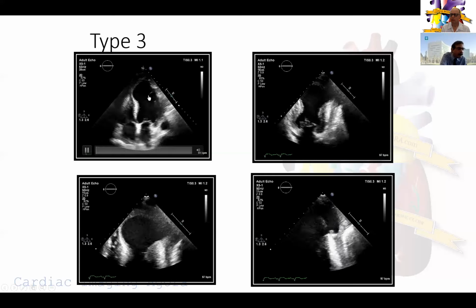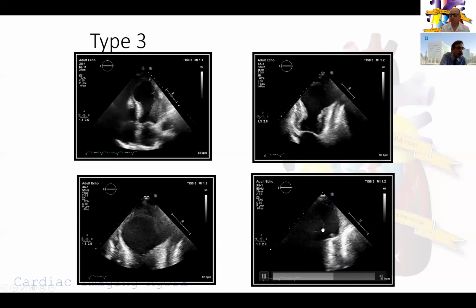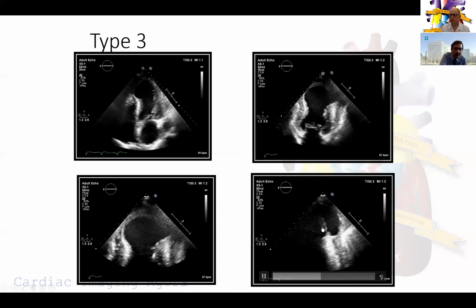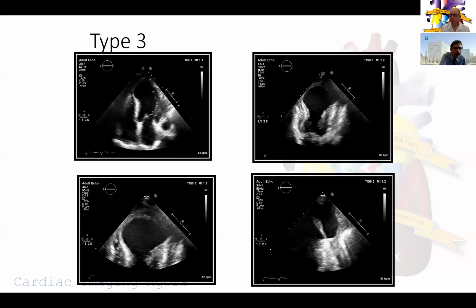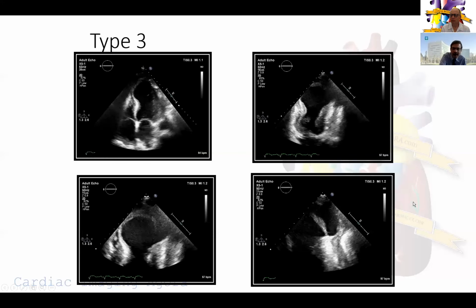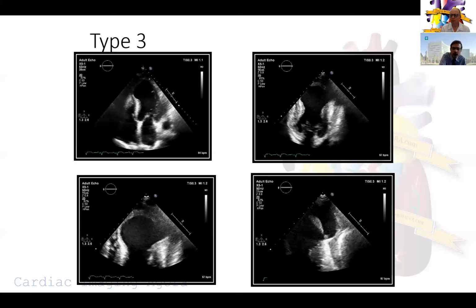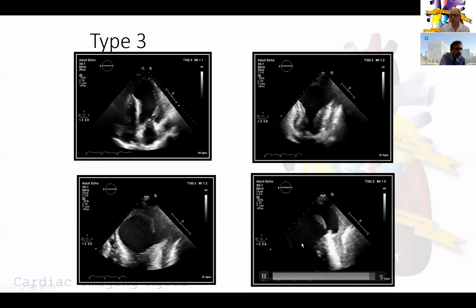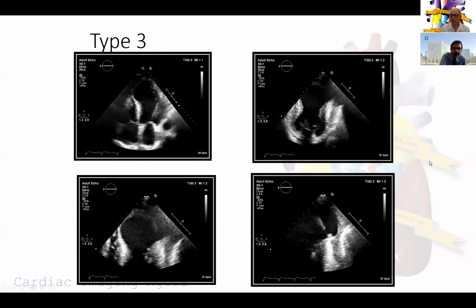So a big difference between how you would manage this case on the top left versus what you actually have on the bottom right, which is now a surgical condition. And so the role of echocardiography in acute cardiac critical care should not be underestimated. And I would encourage all the young listeners in the room to really hone their echo skills, because it's going to make you do the right thing nearly all the time in these very, very hemodynamically unstable patients.